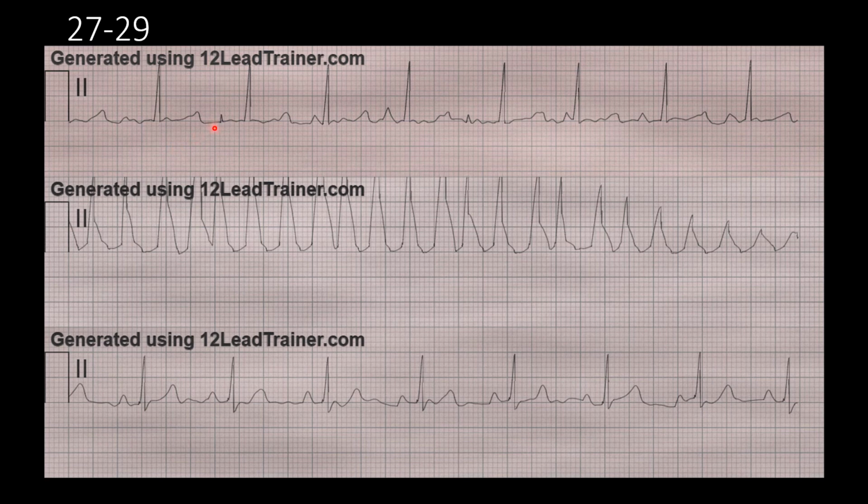And then if you notice here, and maybe there, but especially here, that looks like a pacer because it looks pretty vertical, but if you look really closely, it's not totally vertical like that. There actually is a little bit of a point. It's just really narrow, but it's not completely vertical, so that is not a pacer.